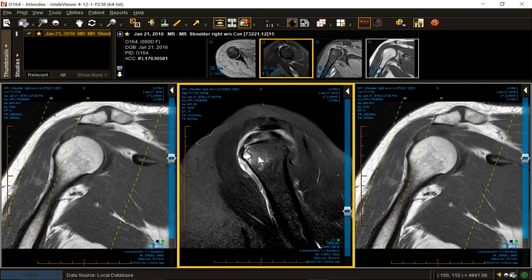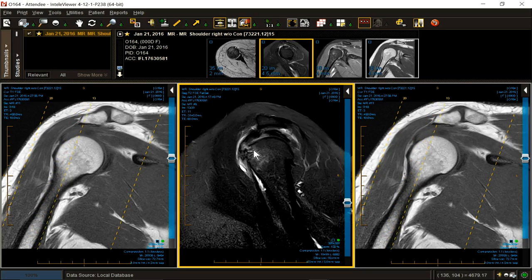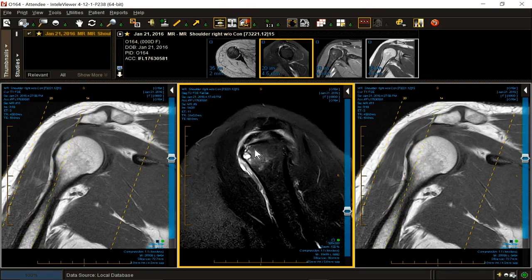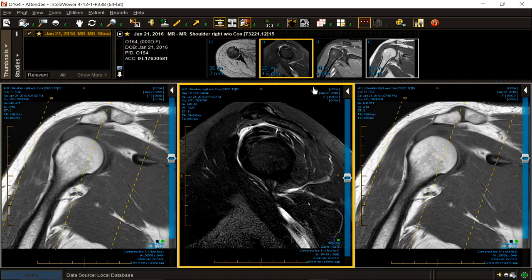So how would this conclusion read? It would read as follows. Supraspinatus confluent tendinopathy and areas of anterolateral tendon fiber failure with multiple foci of interstitial microtear and a small avulsion tear at the anterior foot plate or footprint. Number one. Number two, innumerable pseudocysts in the anterior humeral head, suggestive of abutment or impingement syndrome. Number three, biceps tendinopathy and or chronic tear in the extraarticular space.